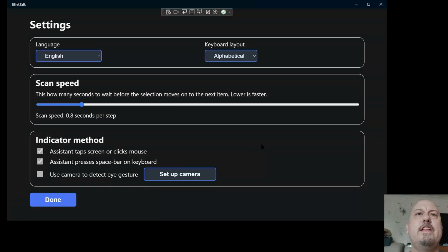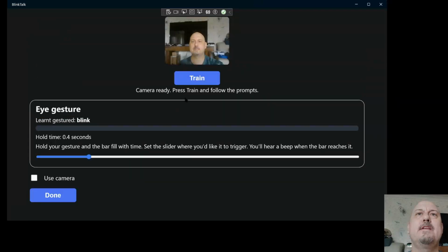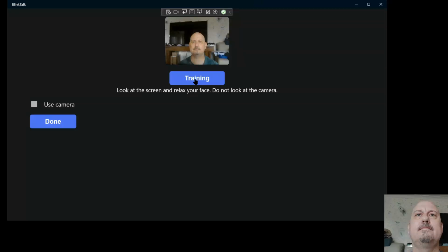This is the first screen that you see when you run BlinkTalk. First thing I'm going to do is set up the camera. Then I'm going to click train. Look at the screen and relax your face. Do not look at the camera.